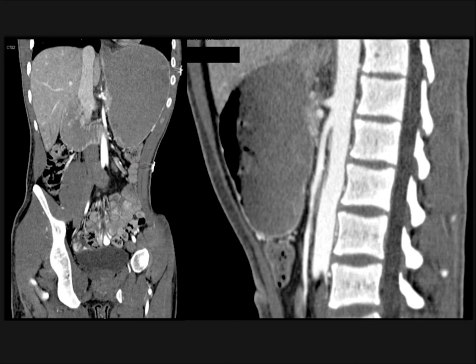And you go back, look how narrow things are. But it's not a surprise to you. This was SMA syndrome, not just simply narrowing of the SMA. If I see narrowing of the SMA angle, I'll say something, but I'll say that in order to call SMA syndrome, I need to see dilated bowel.